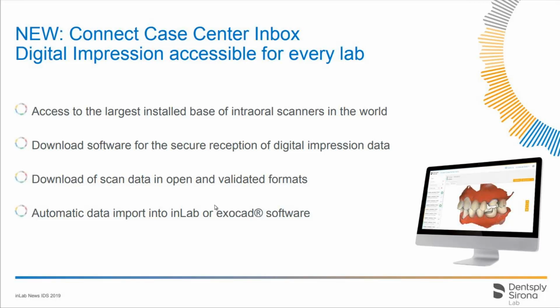It's really cool because if you have, let's say, 10 cases that came in and you want them all just automatically downloaded into inLab software, you can go ahead and do that. Or if you have exocad, you can go ahead and just say, hey, download all these cases into exocad, and if you import it into inLab or exocad, you will get the margin with it as well.